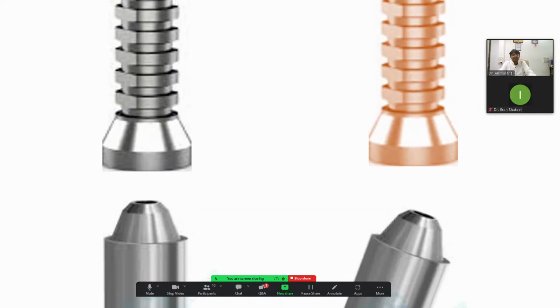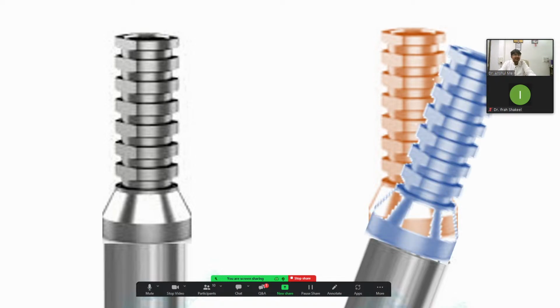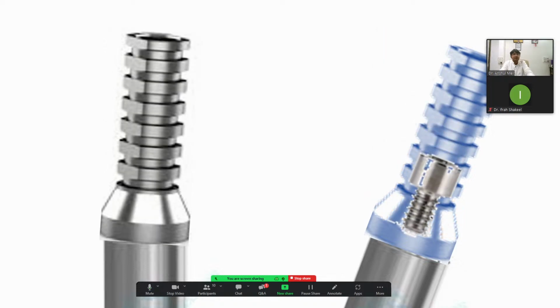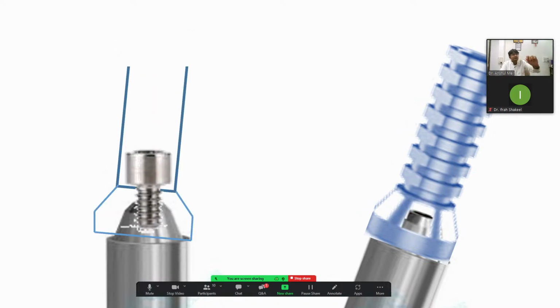So Pathfinder, what it will do: I want this path, but I'm getting this path. The Pathfinder gives you the common path of insertion of both, the mean value of both. So now, if it is not there, if I fix this part, the other part will adapt on tilt on this side, and if I insert the screw, I will get two or three rotations.